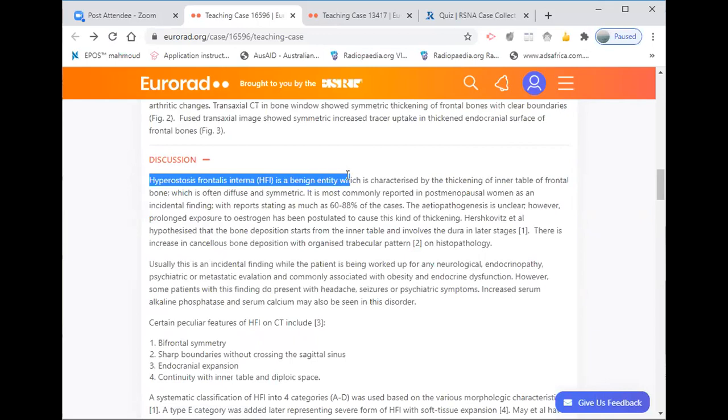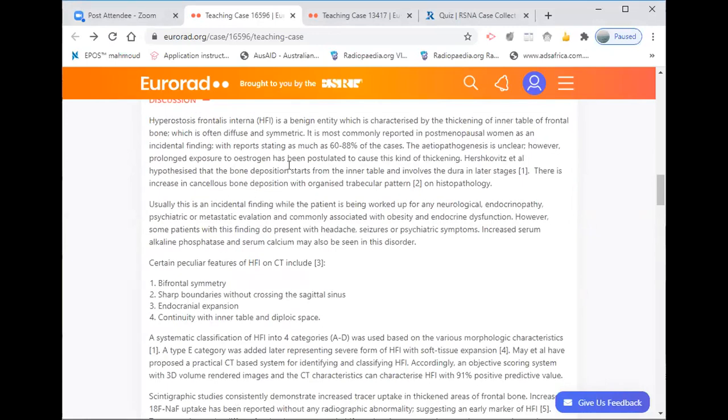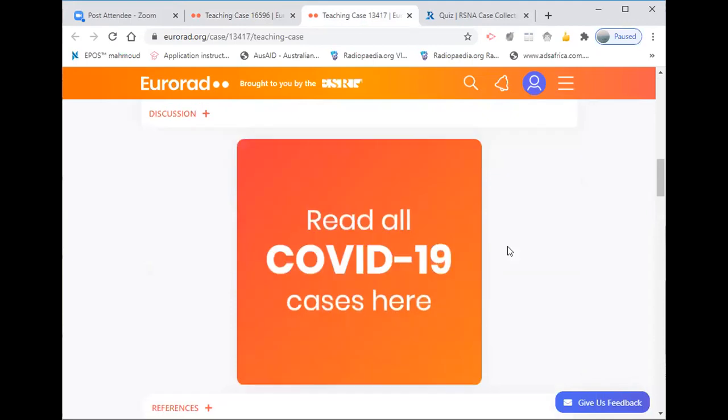And this patient, even if she has breast cancer, when you see the CT image and you know it, it's easy for you to detect that it is not something malignant, it is a benign lesion, okay? So sometimes it is a false positive that mimics metastasis. Okay. Another case.